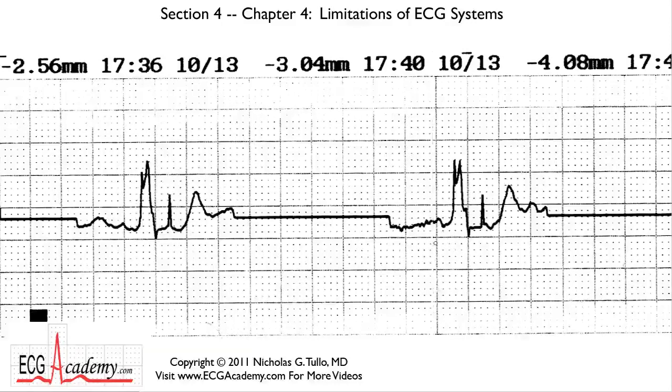I was asked to see the patient because it seemed like their heartbeat was really slow. But one thing you notice, this kind of looks like a T wave, and maybe there's a QRS complex in here somewhere, but it sure looks really bizarre. And then there's a little signal, and then from here to here, again, it looks like someone took a ruler and just drew a straight line. And then suddenly you've got this drop. See how it suddenly drops?